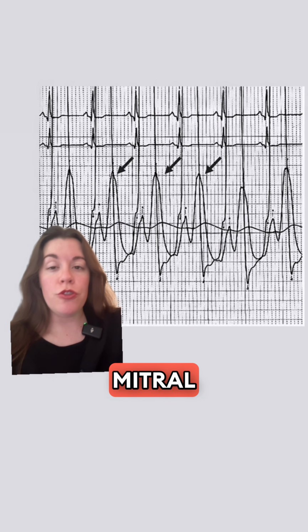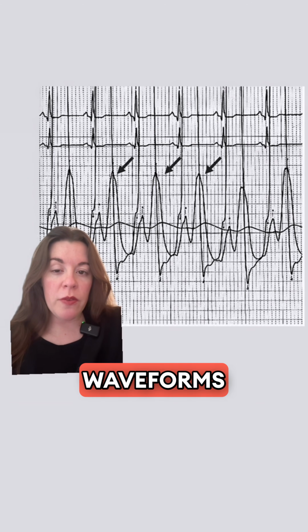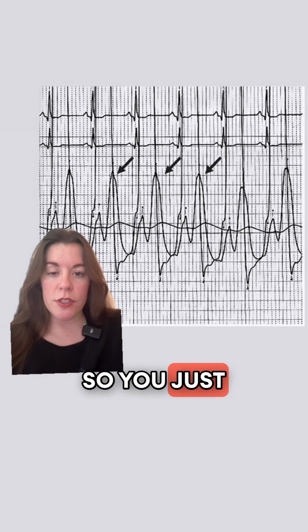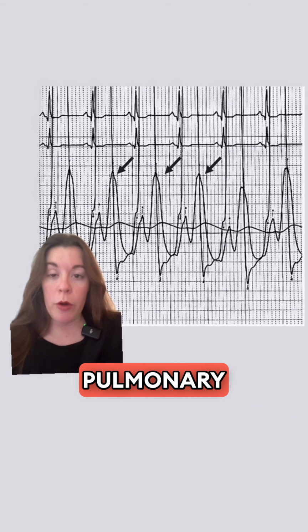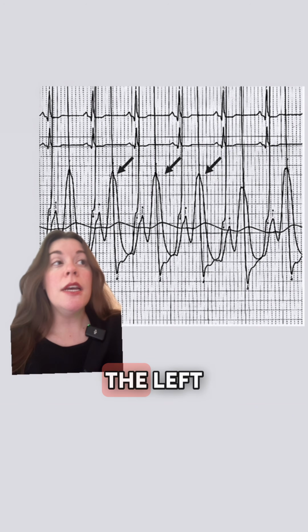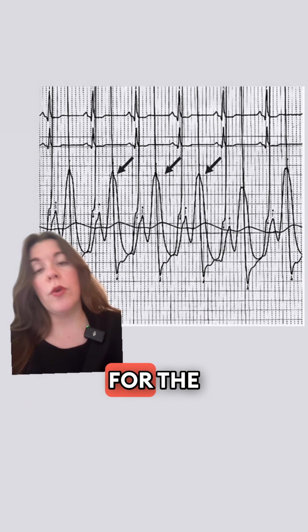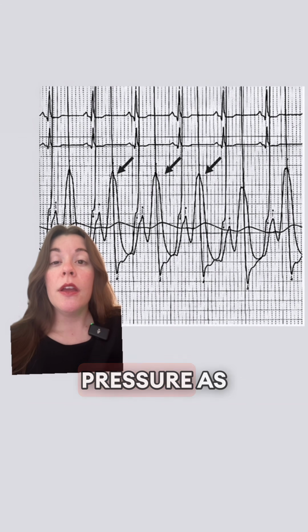Let's talk mitral regurgitation. First of all, what are the components? So there's actually two waveforms here. There's a left ventricle waveform that is kind of zoomed in, so you just see the diastolic part, you don't see the systolic part, it goes off the screen. And then you have the pulmonary wedge pressure, which represents the left atrial pressure, but all of this will also ring true for the tricuspid valve if you are looking at right atrial pressure as well.